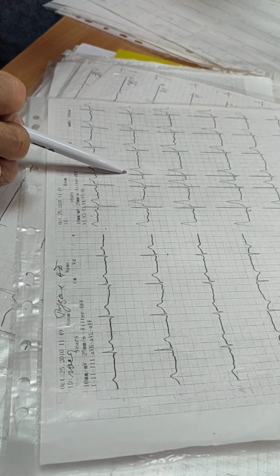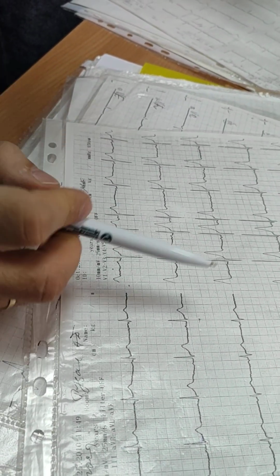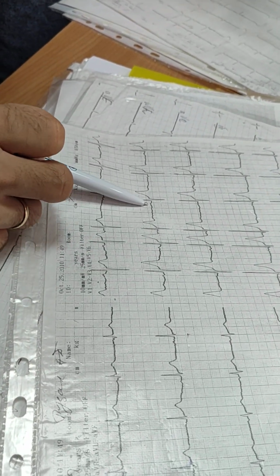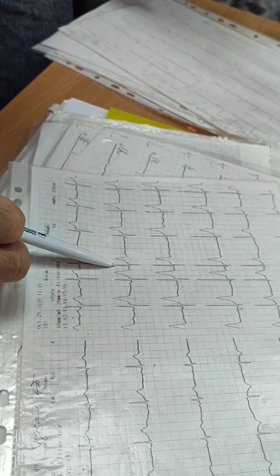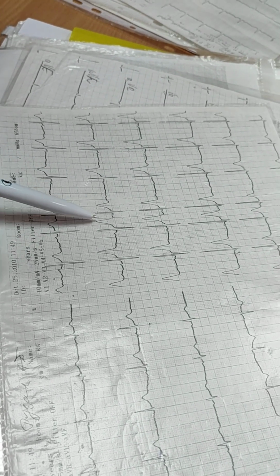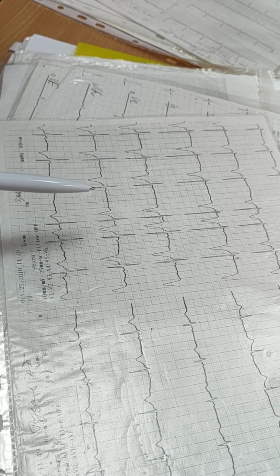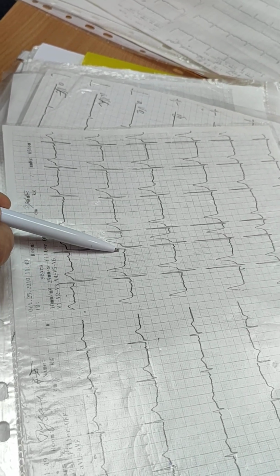There is arrhythmia in this place. P wave, no P wave, P wave, P wave, P wave. So there is no P wave. Complex is narrow. Long pause after short distance before. It is extrasystole. Which one? Supraventricular. Complex is narrow and looks similar to the previous one.